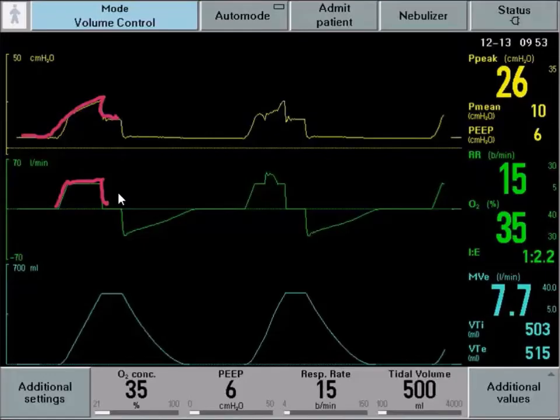What it does is allow the patient to take a higher inspiratory flow, and that's what we're seeing with this second breath. Looking at this second breath, the patient is initiating the breath inside of the breath, so we don't see a drop in pressure beforehand. We actually see a drop in pressure, or a pressure scooping, during the inspiratory phase.